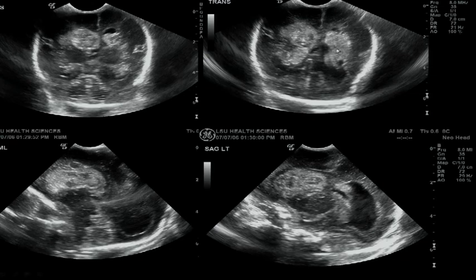Here we have bilateral. The choroid plexus never looks like this. Initially, all blood is going to be real echogenic, real white, and then it's going to start getting black. Is it going to get black more in the periphery or in the center? It's going to get more black in the center first. In the evolution of the hemorrhage, the clot will be echogenic, and then it'll start getting patchy hypoechoic areas, and sooner or later it'll be all black.